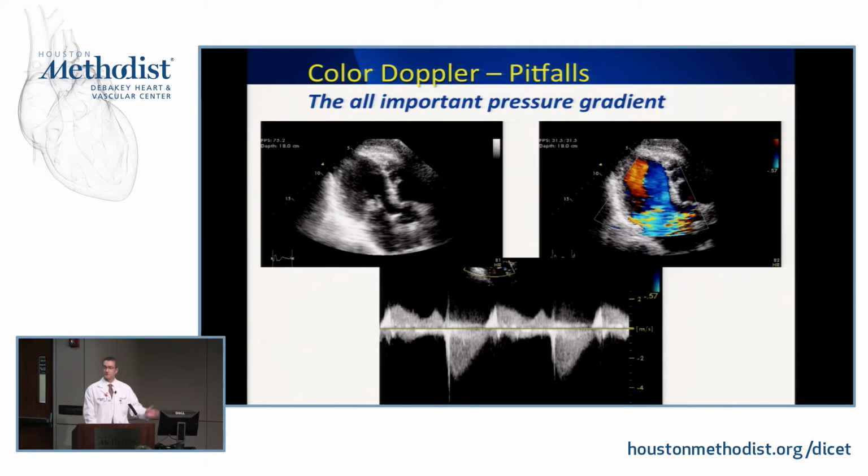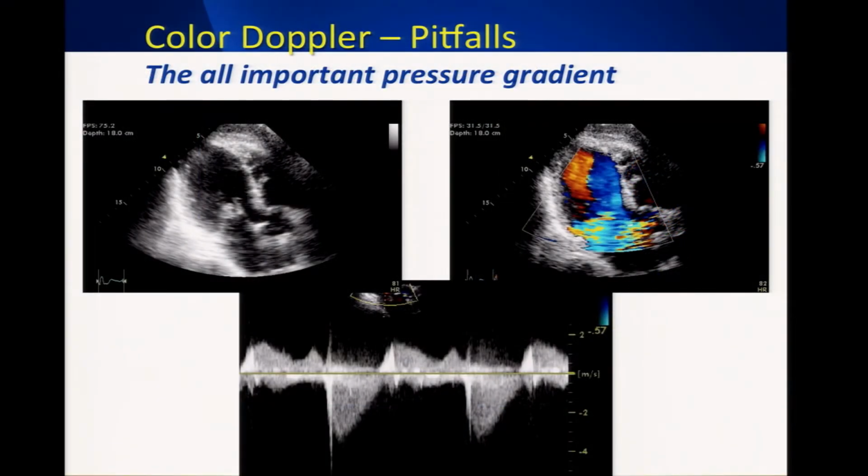Not so much, right? What it tells you is that the pressure gradient between the LV and the LA is basically non-existent. Whenever this velocity is less than 5 meters per second, you've either got a very sick ventricle or you've got no competent mitral valve, because you should have a big pressure gradient between the LA and the LV. And when you don't, this is basically a papillary muscle rupture. So the key to the papillary muscle rupture is a dense, triangular, early equilibration of the pressure across those chambers. But a very underwhelming color, because the color just reflects the velocity, and the velocity in this case is low, yet the amount of regurgitation is enormous. So these are the extreme scenarios to emphasize the point.